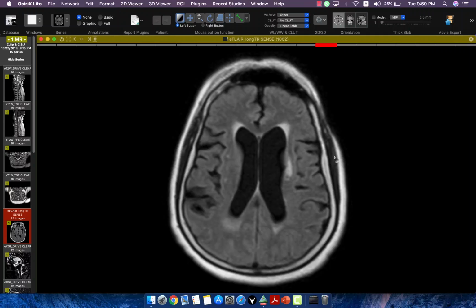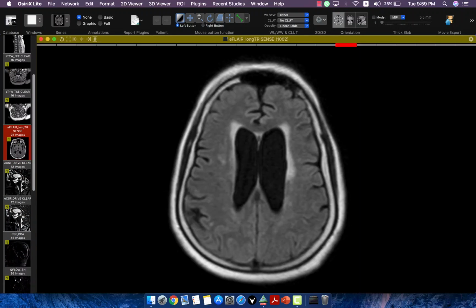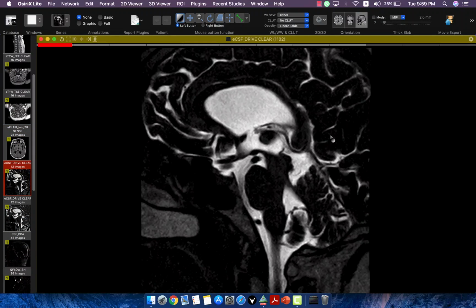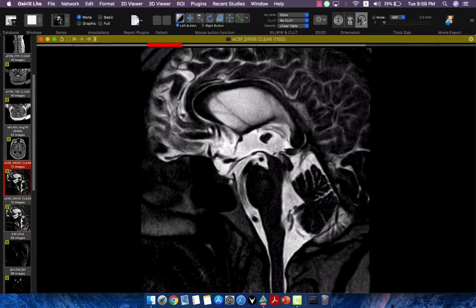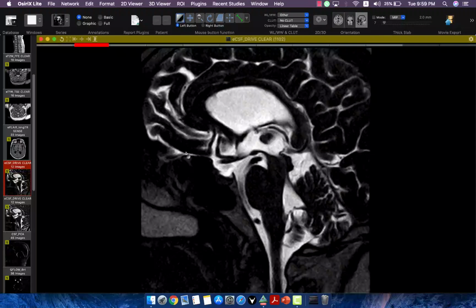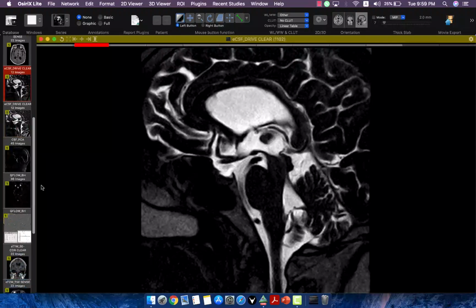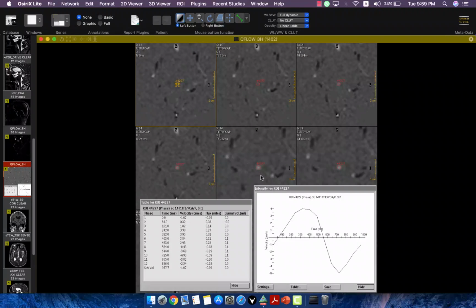So this suggests hydrocephalus, specifically normal pressure hydrocephalus, especially if there is a clinical history of the classic triad. We can also see in the sagittal image an exaggeration of the signal void along the aqueduct of Sylvius. So we did a CSF flowmetry for this patient, and in normal pressure hydrocephalus we are targeting to measure the CSF flow along the aqueduct of Sylvius.